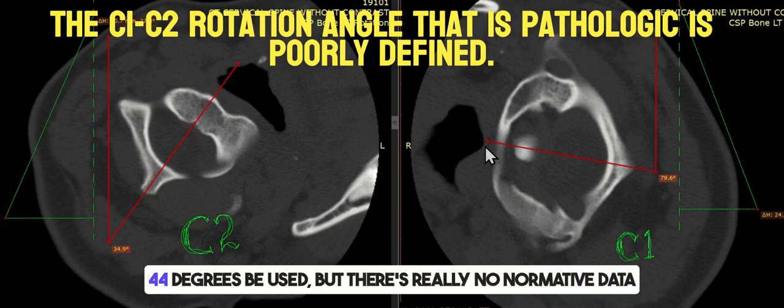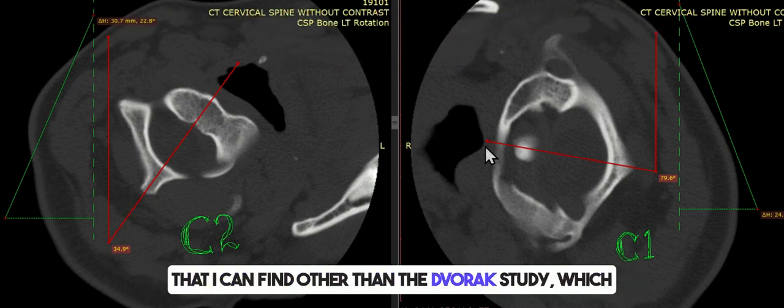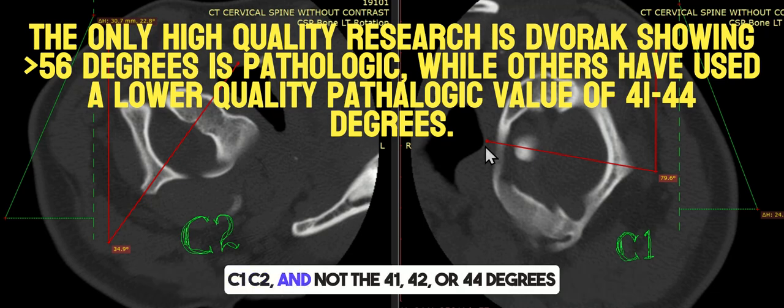I've seen 44 degrees be used, but there's really no normative data that I can find other than the Dvorak study, which clearly shows that the pathologic value is 56 degrees at C1, C2, and not the 41, 42, or 44 degrees that I see being used out there. So again, just another discussion of these rotational CT measurements.